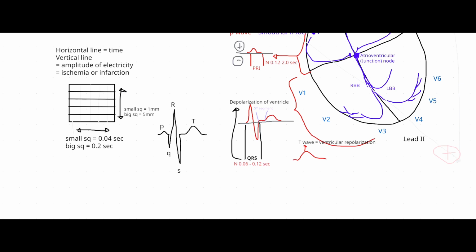So when we're looking at the T wave, and if we're seeing that the T wave is very tall, okay, and I'm going to put the R wave just for comparison because that's what I use to compare it to. Here's the R wave, ST, okay, R, and then here's the T. So if the T wave is high, which we call a peaked T wave, right?